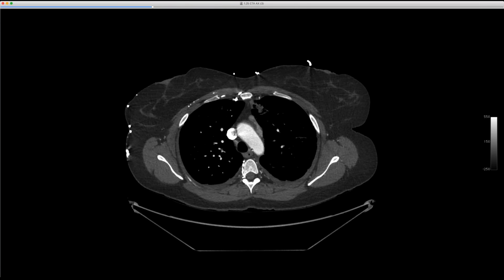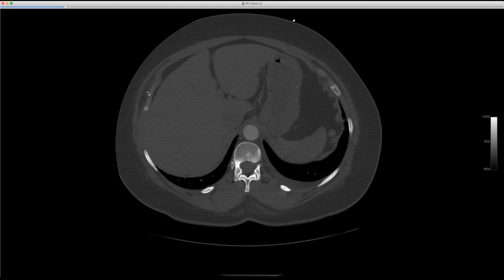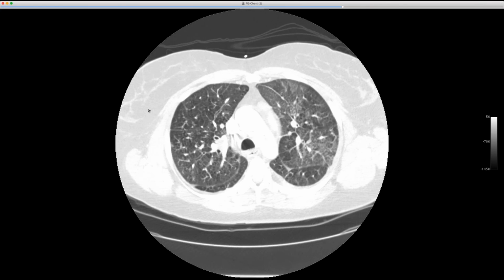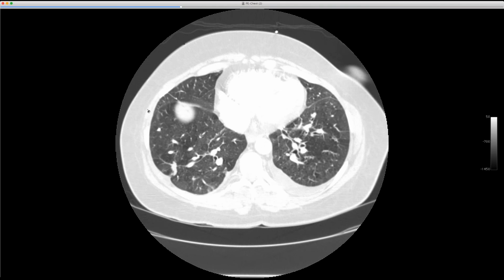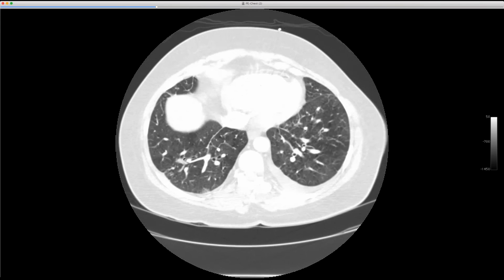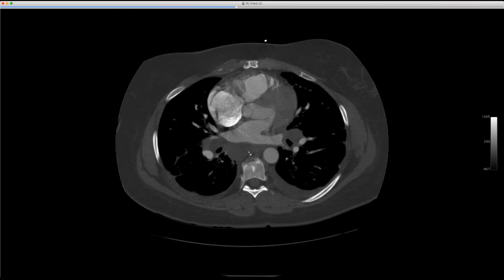So Jeff, what's your interval here? What year is this now? We're 2013 for the first one, about a year and a half later. So the initial one is the lung edema, interstitial edema, pleural effusion. There is venous hypertension. Oh, there's some up there. I wish I had radiographs, but I don't. There's probably less edema in the lower lobes because there's less flow down there. Or there's better drainage, one of the two. It's pretty tight. Very impressive, Jeff.